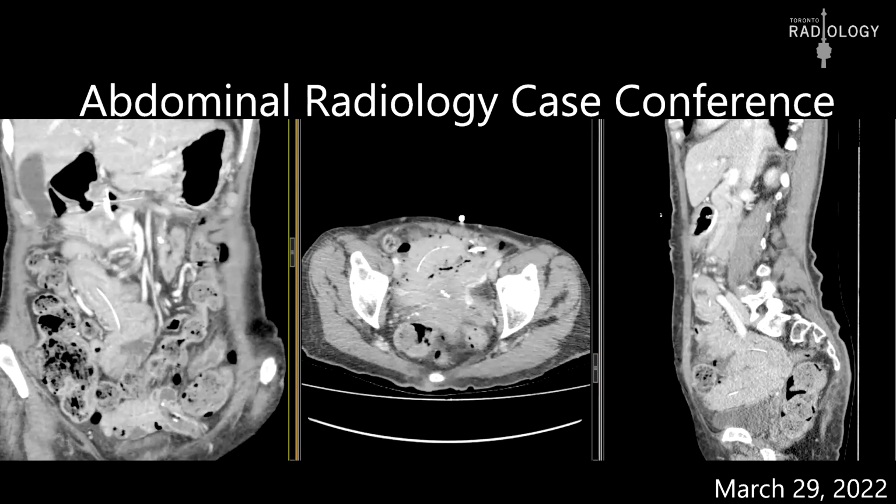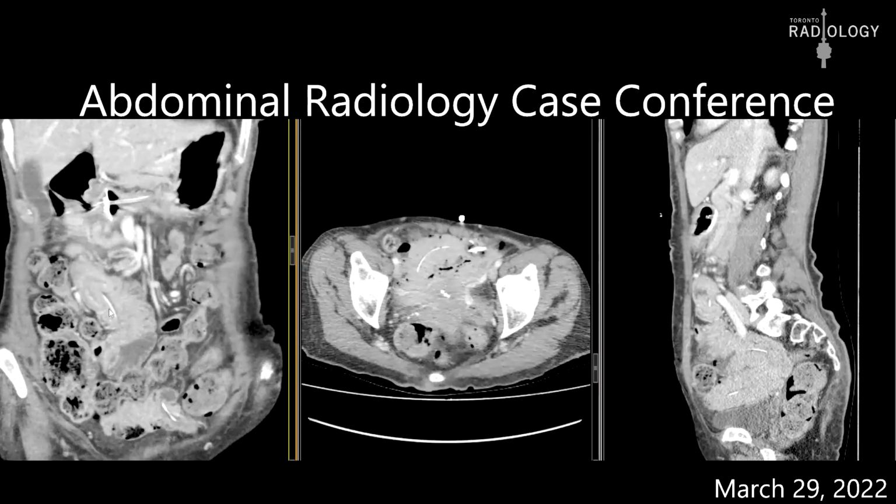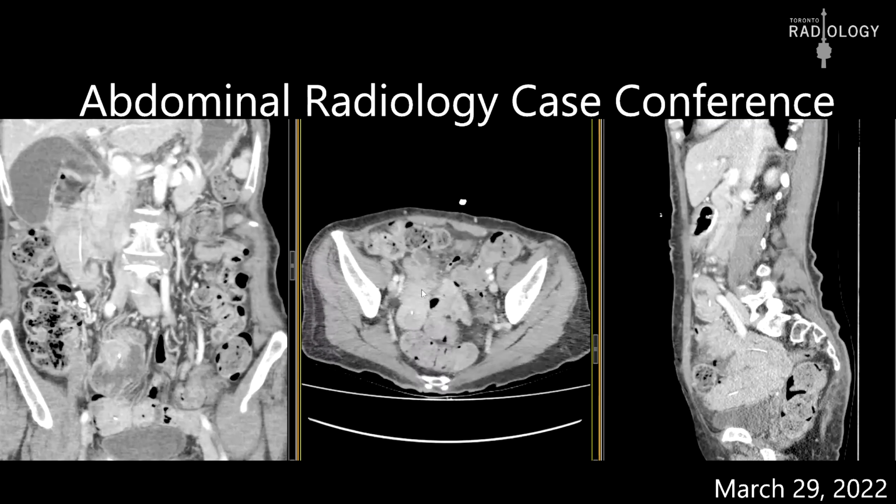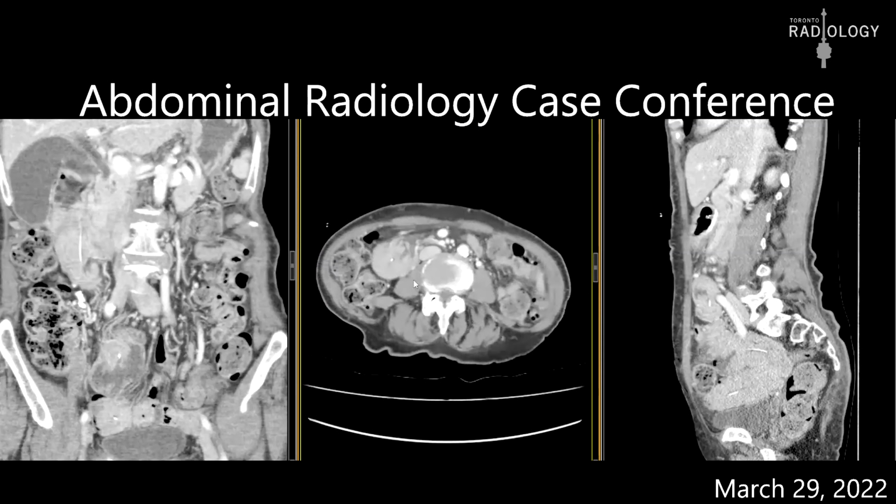It's not a guide wire, right? It's not. It's the actual tube. So this is the actual tube, and the whole thing is the Duodopa tube. According to the clinical history, the Duodopa tube was also there.